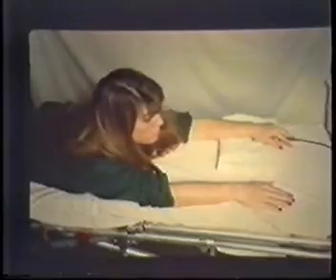Now, I think my time's up. Could I ask you a couple questions about technique? Do you use respiratory compensation? I've had a lot of problems with respiratory artifact on those axials. No, I don't. Early on we had a lot of problems with respiratory artifact too, and I have not found respiratory compensation to be very useful.